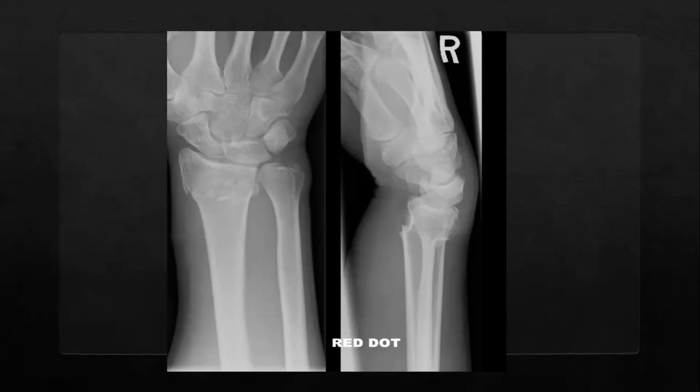Yeah. I'm currently looking at, I'm assuming, the right arm of this patient, and there's adequate exposure, and I've got an AP and a lateral view. On looking at the bones, the carpal bones look all intact. And what I can see of the metacarpals, they look intact too.